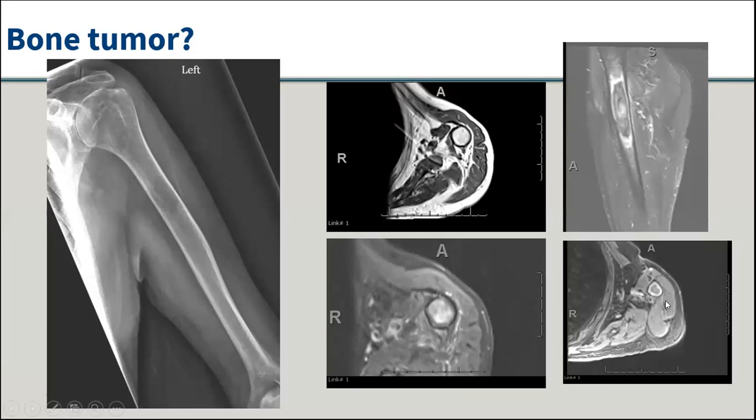And if you ask people, then they say, oh, it may be a hemorrhagic cyst, it can be a tumor, we don't know. Again, it's an older patient, there are already rotator cuff changes, you can see the narrowing, bony hypertrophy, etc. If you do the DWI, you can see this bright lesion and really dark. That's a high-grade tumor. This was a bone metastasis. So, pretty easy call. Every time somebody asks me about tumors, I'm looking for this ADC image. It's so helpful.